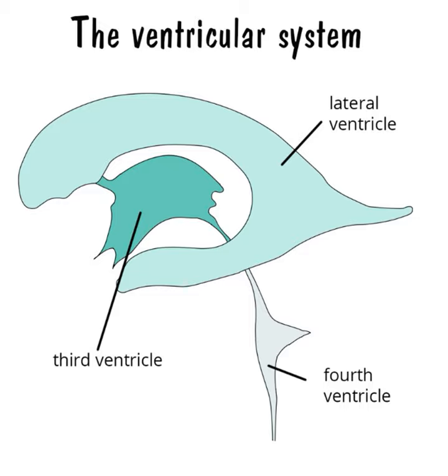We need to remember, when we are looking at sulcal spaces in children, we need to know what the variations are based on age. If the child is less than 2 years of age, a benign enlargement of subarachnoid spaces is a normal condition. Children can have prominent sulci without any underlying hydrocephalus. The way to distinguish benign enlargement of subarachnoid spaces from hydrocephalus is usually with serial imaging to see if there is progressive increase in the size of the sulci.